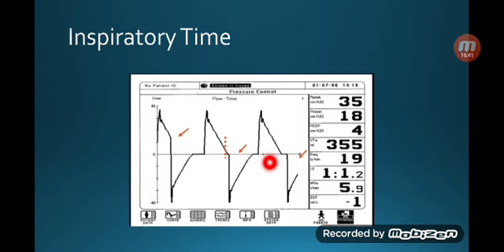So with the next 4 or 5 breaths, that might be the case. If you've already set it like this, then in 4 or 5 breaths, you might get that or that, you don't know, but you're here. But if you keep this little shoulder being your safety net, then usually you're in a safe place. And again, it's better to keep the lung in better status.